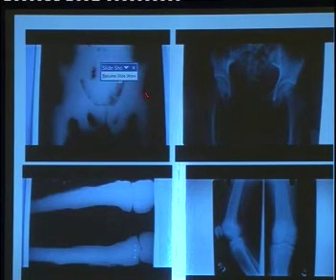Fluorosis, skeletal fluorosis. Here you see osteopetrosis or marble bone disease, you will see the bone outline will be absolutely normal. Outline will be normal. But here you will see some irregular bone formations. And in the sacrotuberous and sacroiliac ligaments, there is a lot of calcification, including the vertebrae, which I cannot show you. But irregular bone formations are characteristic of skeletal fluorosis.